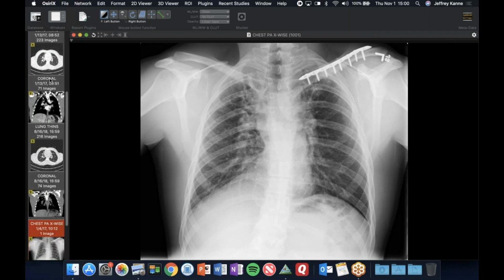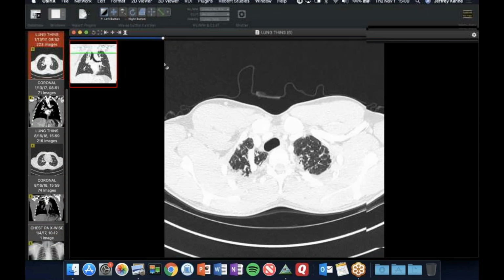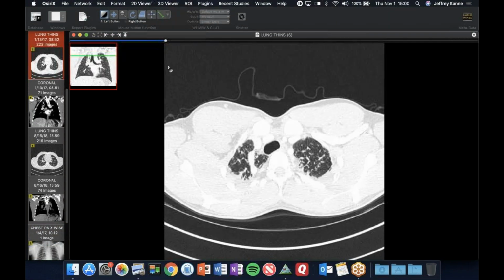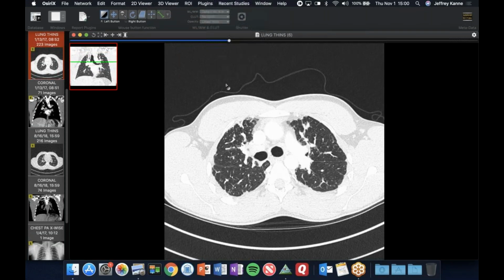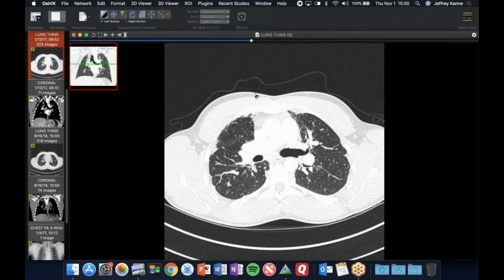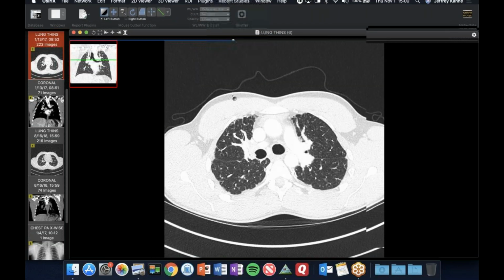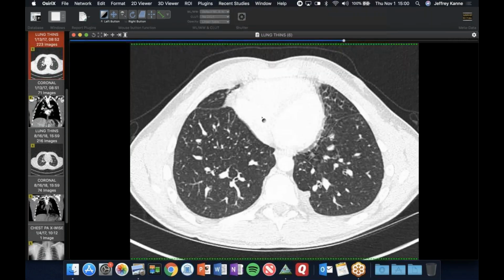I've got two dates. I'll show the one at the time of this radiograph first, and we see he's got an azygous fissure. He's got this subpleural reticulation that's more than you'd expect to see in a 27-year-old, but striking volume loss in the upper lobes and even some thickening along the bronchovascular bundles, but very much a subpleural fibrosis, not nodular enough to call sarcoid, in my opinion. And he's got that volume loss.